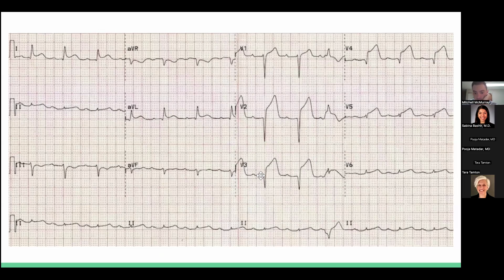So here's the baseline that we're looking at, the P wave, and then we go 1, 2, 3, 4, 5. There's like 5 elevations here. And we're like, oh, that doesn't look very good, but I'm not sure. We can look over to remember our PALES mnemonic.